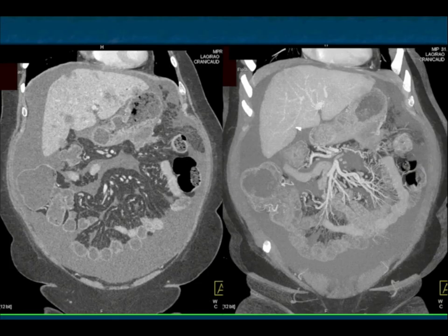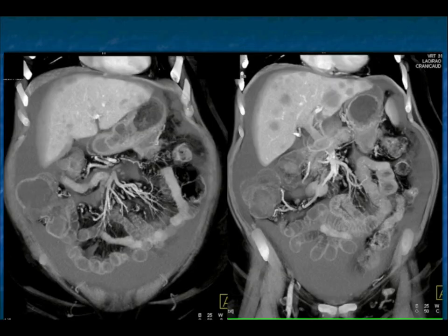So we look very carefully at the omentum. When cases are this extensive, obviously it's not very subtle, but subtle implants on the omentum can be challenging unless you're careful. Some centers will actually do laparoscopic surgery and look around your peritoneal cavity before they do a Whipple's, to make sure they're not missing tiny mets on the liver or on the peritoneal surface.